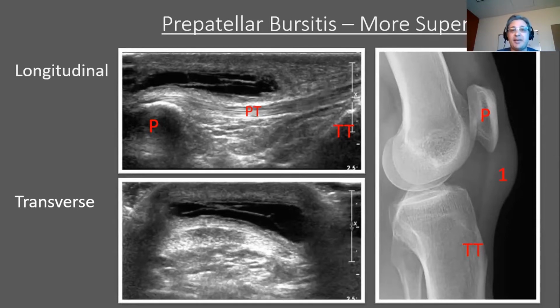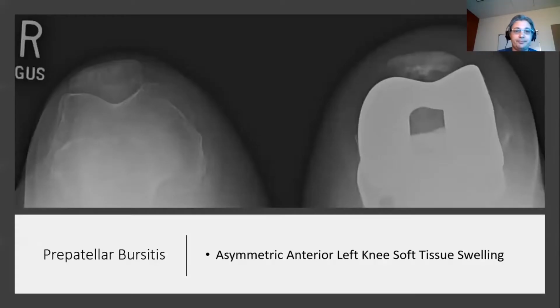Anatomy is key to making the diagnosis, because as you've seen, the imaging appearance of bursal inflammation can range from a very simple appearing cystic mass to a very complex solid appearing mass. So we can't rely on the intrinsic imaging appearance predominantly. We need to rely mainly on the anatomic location.